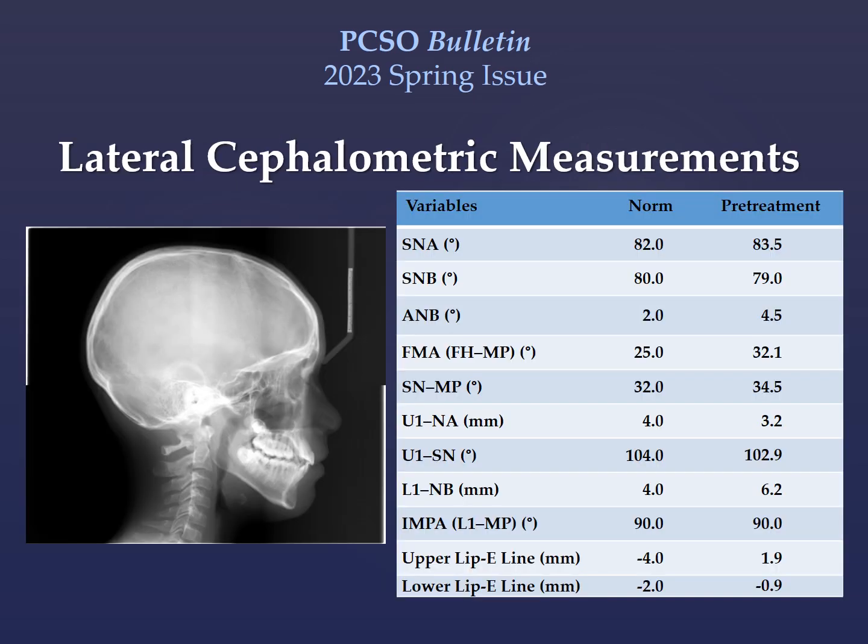The lateral cephalometric analysis indicates an orthognathic maxilla and mandible. However, due to a slightly higher than normal SNA and slightly lower than normal SNB, there was an increased A to B, which indicates a skeletal discrepancy. His mandibular plane angle is increased, indicating a hyperdivergent skeletal growth pattern, and he also has a retrusive chin button. Dentally, both his maxillary and mandibular incisors are well positioned.